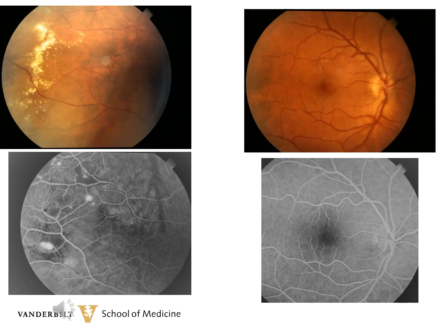This is a 25-year-old male who was noted to have some abnormal findings on a routine examination. In the temporal periphery, you can see dilated telangiectatic blood vessels, as well as areas of capillary non-perfusion, and dilated capillaries in these areas. You can also see some larger aneurysms fairly easily on the angiogram as well.